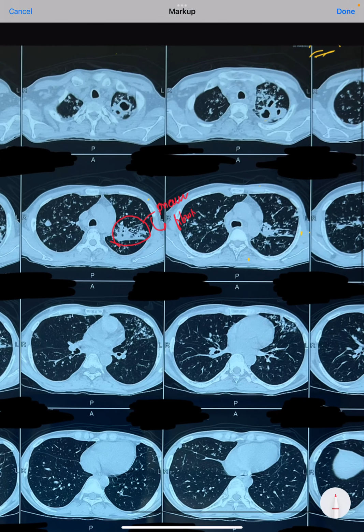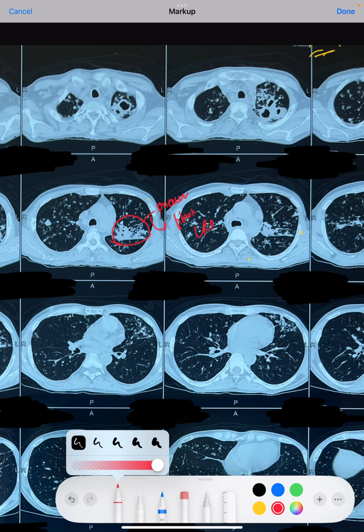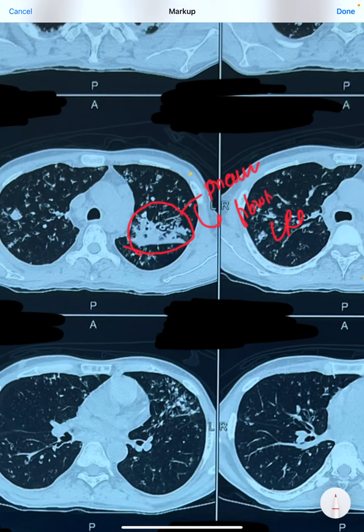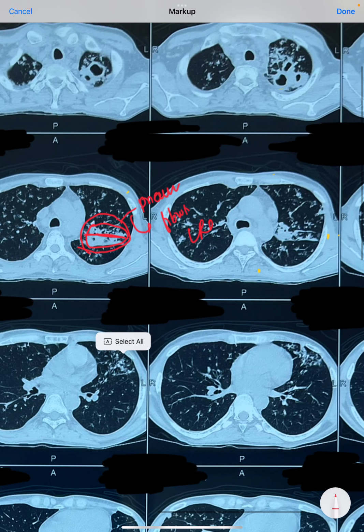So presence of this cavity with such a patch highly suggests that this is an active lower respiratory tract infection, or an active pneumonia patch. One more thing, if it is fibrosis, there should be loss of lung tissue, so there should be more of a contraction. This distance and this distance is almost the same as this and this, or this and this. So this border and this border almost have equidistance from each other.